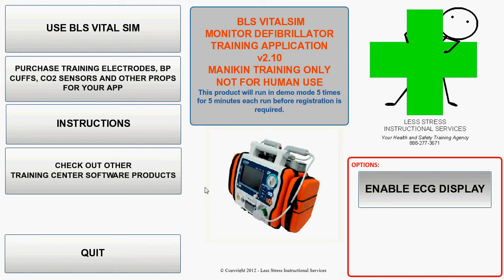BLSVitalSim training app. So what you're looking at here is the main screen for the BLSVitalSim app, and this app is really designed to teach the emergency medical technician level provider. It will do automated blood pressure, and it'll do pulse oximetry, and it will do heart rate management and display. It'll also act as a fully automatic, or I should say a semi-automatic defibrillator. So you'll be able to combine the AED trainer simulation with the automated blood pressure and pulse oximetry and heart rate simulation.